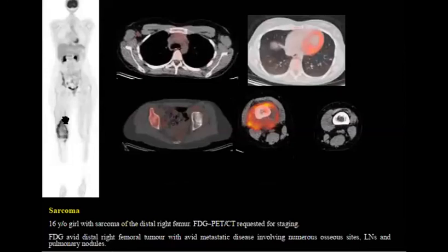The primary, the osteosarcoma, and there is metastasis to the lung, and some lymph node, which is maybe here, but I'm not sure because this could be, yeah, maybe axillary, and right axillary. I agree with you, but not very high uptake, but okay.